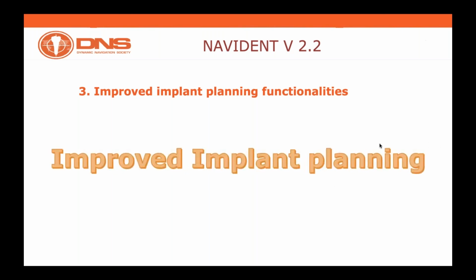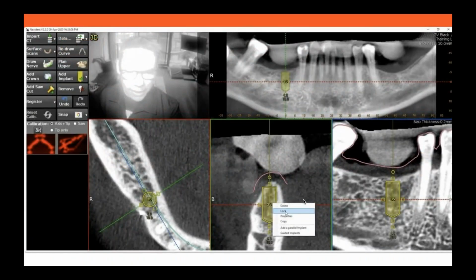So I will now dwell on some aspects which I feel are equally useful in terms of novelties introduced with version 2.2, and I'm referring to the implant planning.